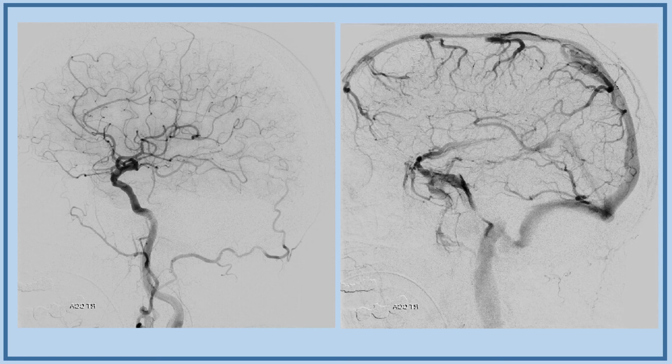We have another case where the contralateral MMA happened to be going to the area of supply. Some other things too, besides the usual recurrent meningeals. The point is, with the dura, nothing is written in stone. It's not just about the MMA. There could be some other things to worry about too.